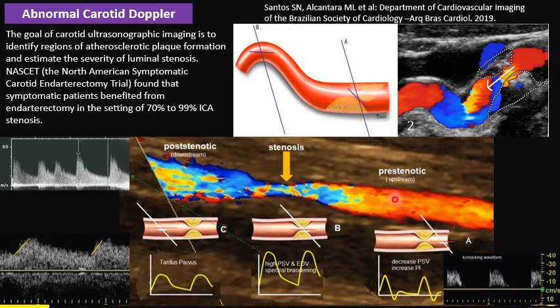In this situation, at the proximal of stenosis, not only does the peak velocity decrease, the upstroke becomes sharper or more vertical. In other words, acceleration time decreases very sharply, and we have some degree of spectral broadening, and we will not see too much forward or antegrade blood flow during diastole. So this is a specific pattern for severe stenosis at the level proximal to the stenosis.